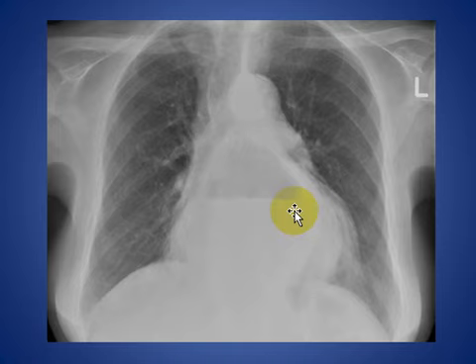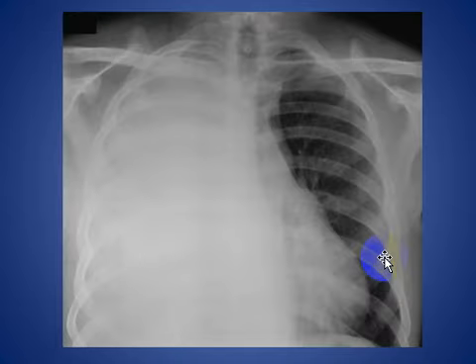Hiatus hernia is herniation of the abdominal content through the esophageal hiatus of the diaphragm into the thoracic cavity, and it is common and increases with age, and it is common in female patients. As we see here, this is a female patient and this is the gas shadow. The lungs are clear and this patient might present with aspiration pneumonia or other clinical conditions.